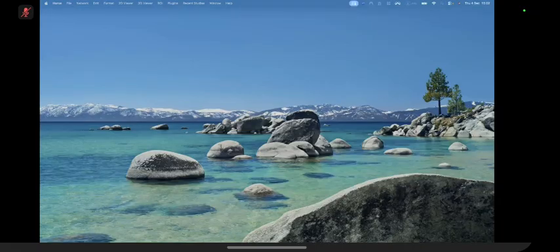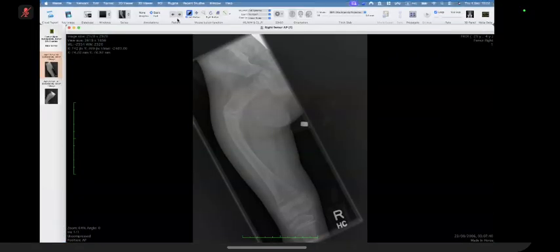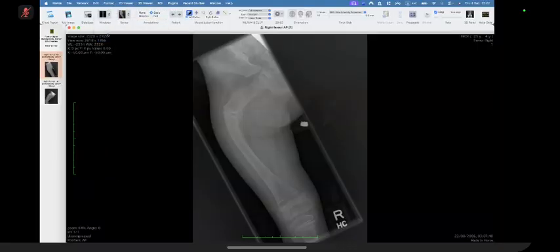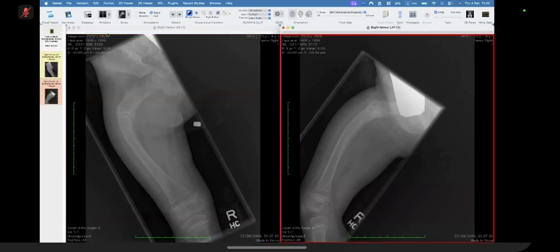Okay. All right, candidate number 4. Hello, sir. Good evening. I'm candidate 4. Okay, candidate 4. All right. Okay. Let's start off with this case. And I'm going to show you both the images. Okay.